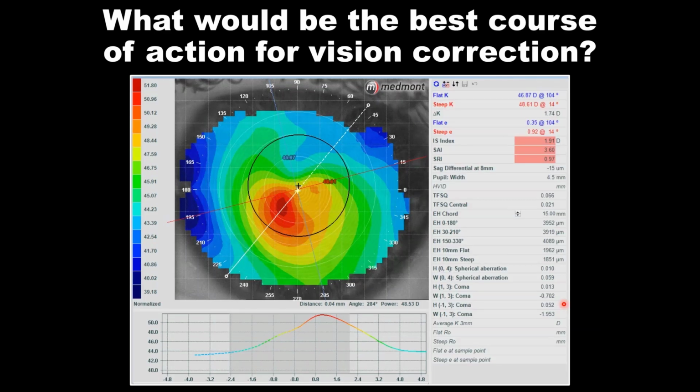So when we consider plans for fitting this patient, we're assuming that vision is going to be hindered because we have a relatively irregular cornea. But could a soft keratoconic lens be used, a custom soft? Is it possible that it could mask the irregularity that we're looking at? Well, let's find the flattest point we can read, 39.25. So we're taking this dark gray area of the graph across the most irregular axes of the eye.